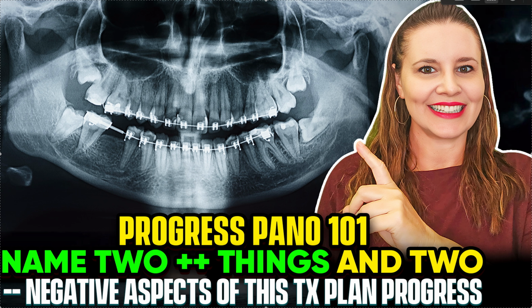Now, you should definitely check out all the content I've already made on Straightwire and braces transfer cases. I'm not going to get into the logic of this and the risks of transferring. I'm just looking at this pano and seeing what I see. And of course you take the data from what you see in the pano, and then you go ahead and take a look at the patient and connect the dots to make your treatment plan or your problem list or your differential diagnosis list. That's actually my preference, to always see the pano first before I see the patient. It doesn't always work that way, so just roll with it.